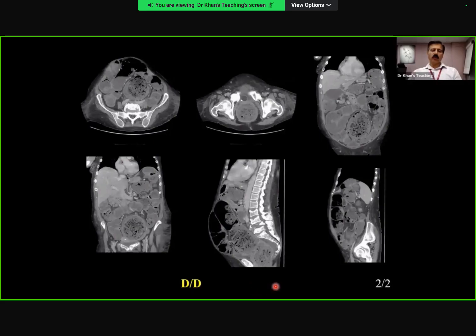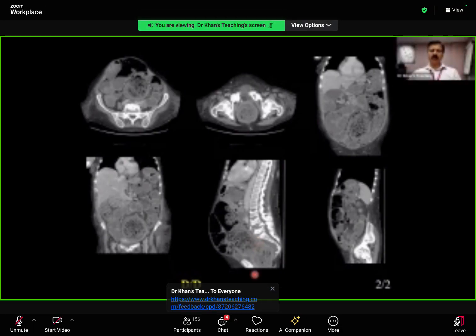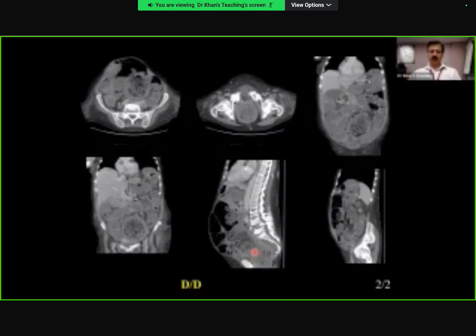Okay, so impaction. In these cases, two things are very important. One is anal canal cancers. You have to ask the clinicians to have a look. That's a clinical territory, right? They can have a look. The patient might have an anal canal tumor, which is causing stenosis. So that's a potential viva scenario. Otherwise, in this particular case, there was no anal canal lesion or anything.